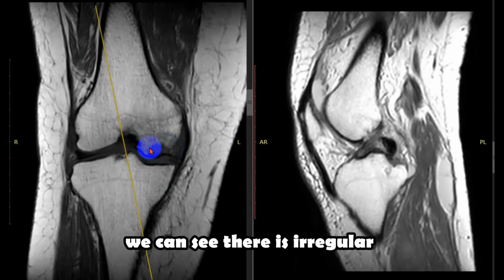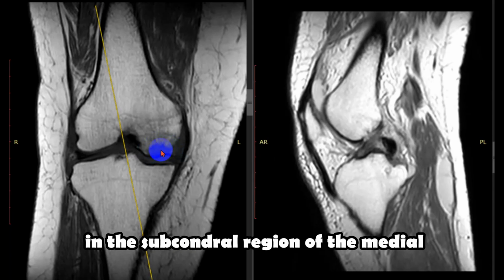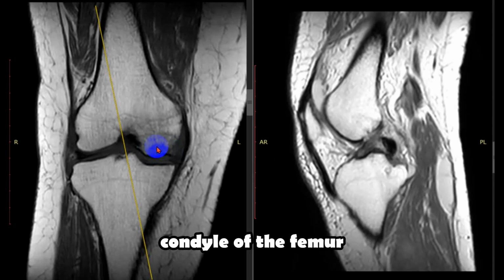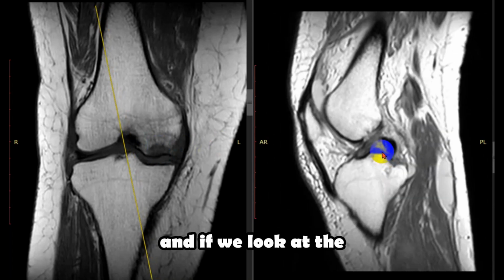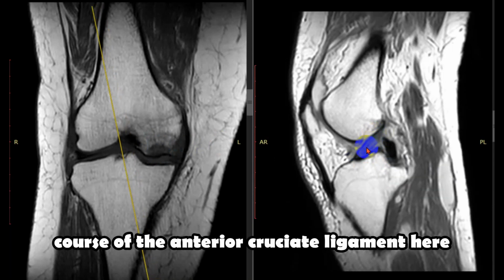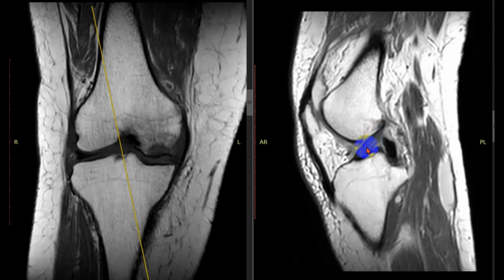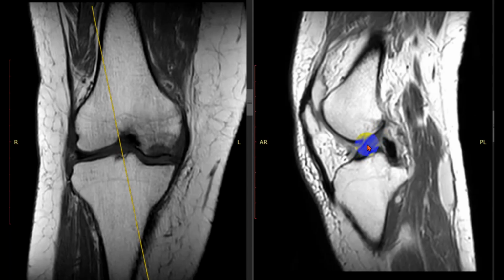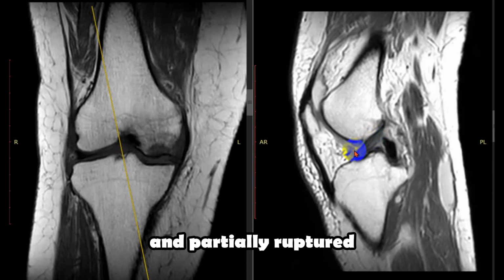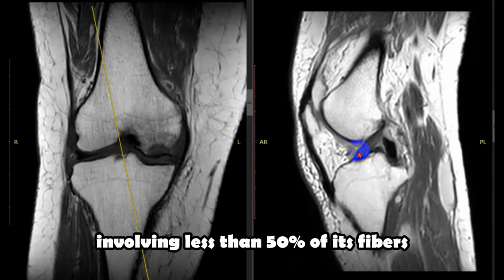Okay, first of all, if we look at the medial condyle of the femur, here we can see there is irregular hypointensity in the subchondral region of the medial condyle of the femur. It is suggestive of subchondral insufficiency fracture. And if we look at the course of the anterior cruciate ligament, here we can see the apparent midpart are diffusely thick and partially ruptured, involving less than 50% of its fibers.